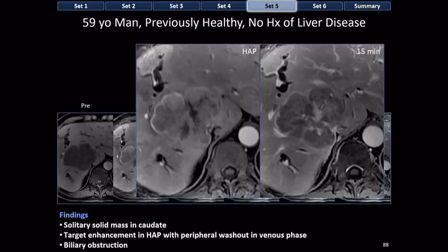Notice also that this lesion is obstructing bile ducts. Those are the black tubes that you see, black branching tubes outside the mass. Also notice that this mass has a very lobulated appearance. I don't know if you guys paid attention to this, but when Dr. Clausen showed a gross pathology image of intrahepatic cholangiocarcinoma, there were some satellite nodules around it as well as some lobulation. So these cancers often have a very lobulated appearance and often will have satellite nodules.